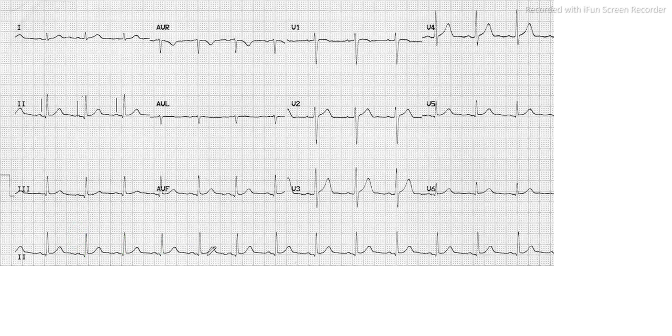Now another criterion is the PR interval. This is the PR segment or the PR interval, and the PR interval must be constant. What I mean is that suppose this is the P wave, and again it goes like this, and this is the T wave, and here again comes the P wave.